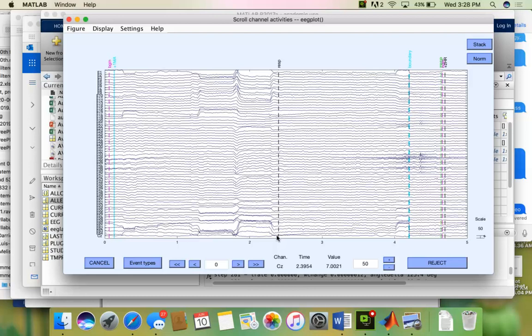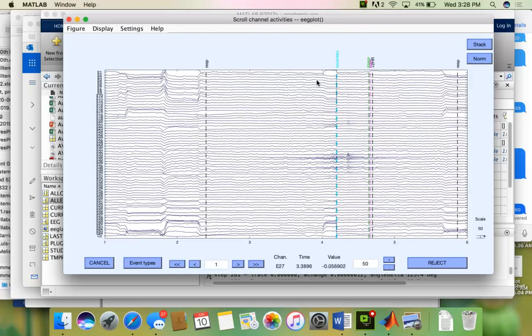So was it happy, sad, or mad? At this point they gave a response, hopefully saying mad. Then a couple of seconds go by, and the system is reinitialized. Let me flip over a little bit.